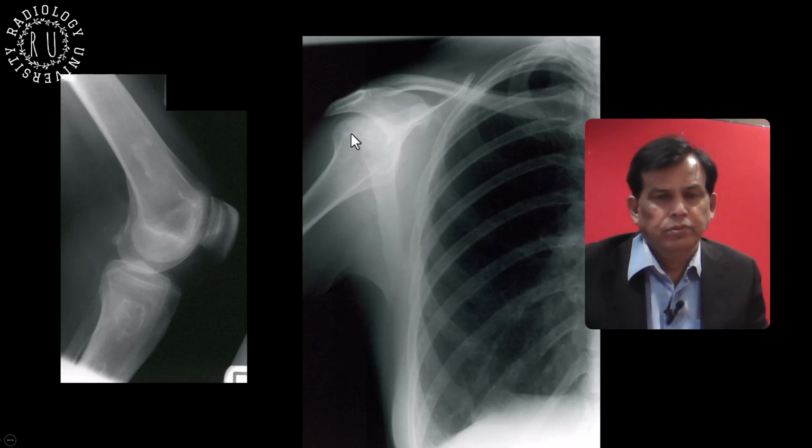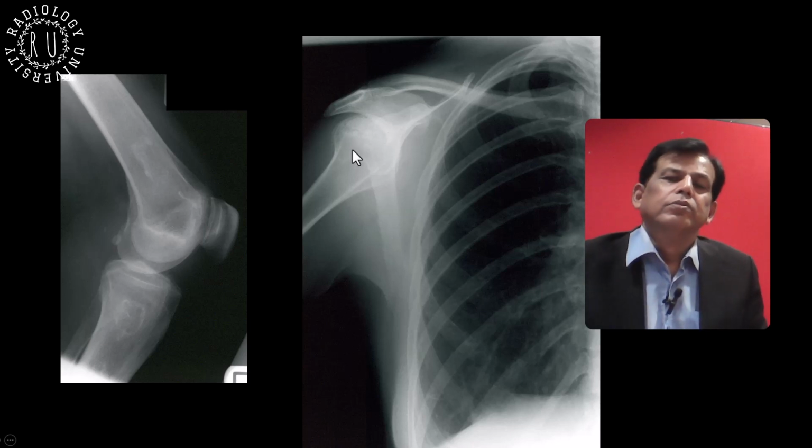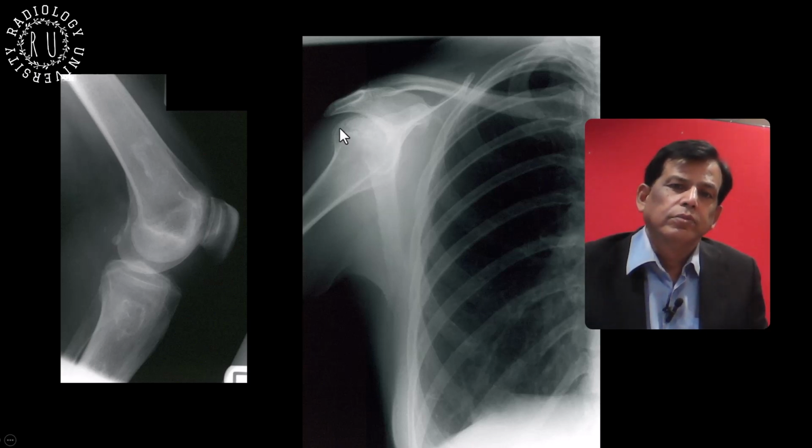Coming to the shoulder, I can see in the humeral head some sort of increased density, sclerosis, again with a linear irregular lucency within. I'm trying to see for any fractures. These medullary irregular opacities look to me like an impression of medullary infarct.